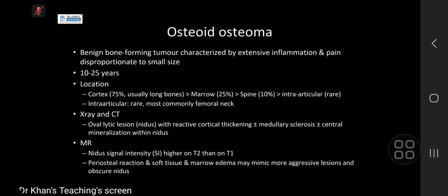So in a case of a patient with pain and diffuse marrow edema, this should be up there with infection as a cause. You tend to see that nice lucent nidus, which can have central sclerosis within it. And if you're lucky, the nidus tends to be small, so you don't always actually see it on the MR. The CT is really the clincher here, particularly in that case.